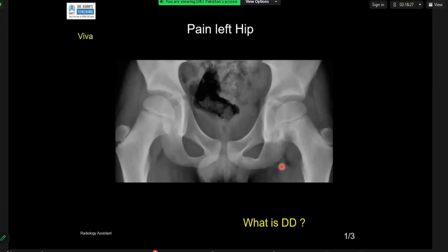There's endosteal scalloping of the cortical margin, so potentially a bone cyst, and another differential, but not very likely, is an aneurysmal bone cyst. But there's no multiloculated appearance or septa within. So I would go with non-ossifying fibroma.